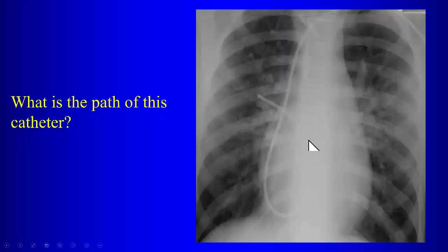Now you can see this in children, right? When we read the radiographs on infants, sometimes an umbilical venous catheter winds up over there, right? What's it going through? Is there a VSD? Not a VSD, but ASD? Yeah, ASD or patent foramen ovale, right?